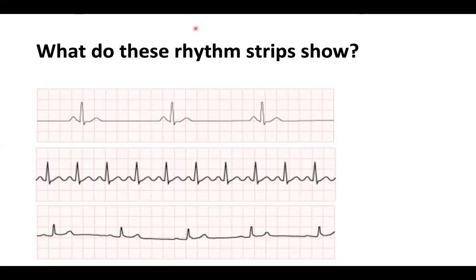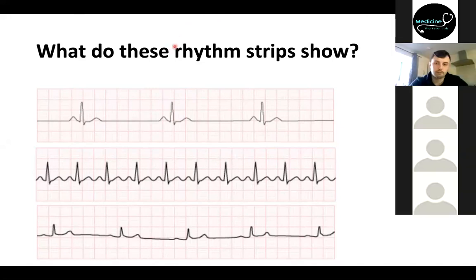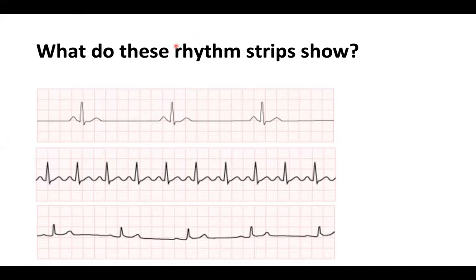No, it's not heart block. Okay, let me just explain and close this. When I use the laser, it's very difficult to close the chat. I think Martina has it, unless I'm wrong. First degree heart block? No, sorry. That's why I was saying no. Yeah, so Floyd Smith has it. It's sinus arrhythmia. Sorry, I'm just trying to get this silly pointer. When it's a highlighter, it's really hard to close the chat.